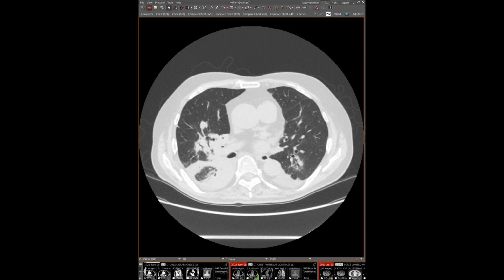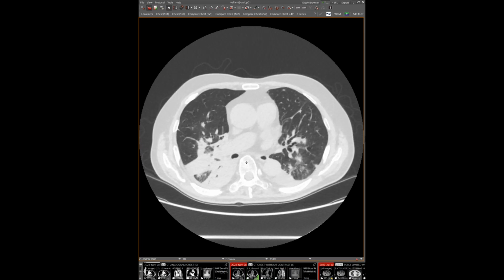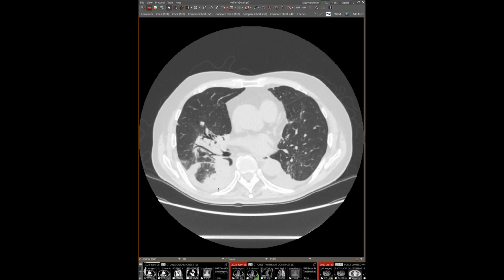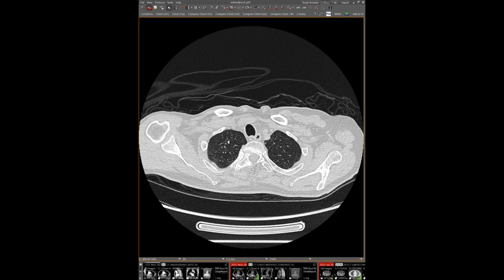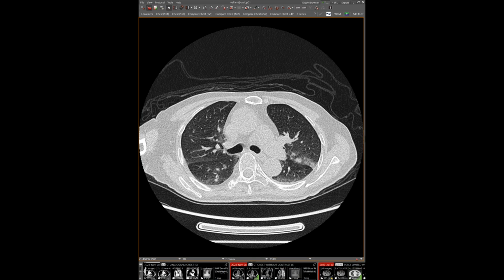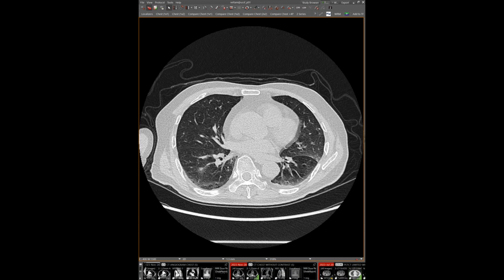And then we come down bronchus intermedius. There's our right middle lobe bronchus and our right lower lobe bronchus. So it looks as if this patient's right upper lobe has essentially torsed down into the inferior part of the patient's chest. And just going back quickly to their prior, this was not the case on their prior exam. Trachea, right main stem bronchus, here's our right upper lobe bronchus going exactly where we would expect it to go. And then bronchus intermedius, right middle lobe, right lower lobe.